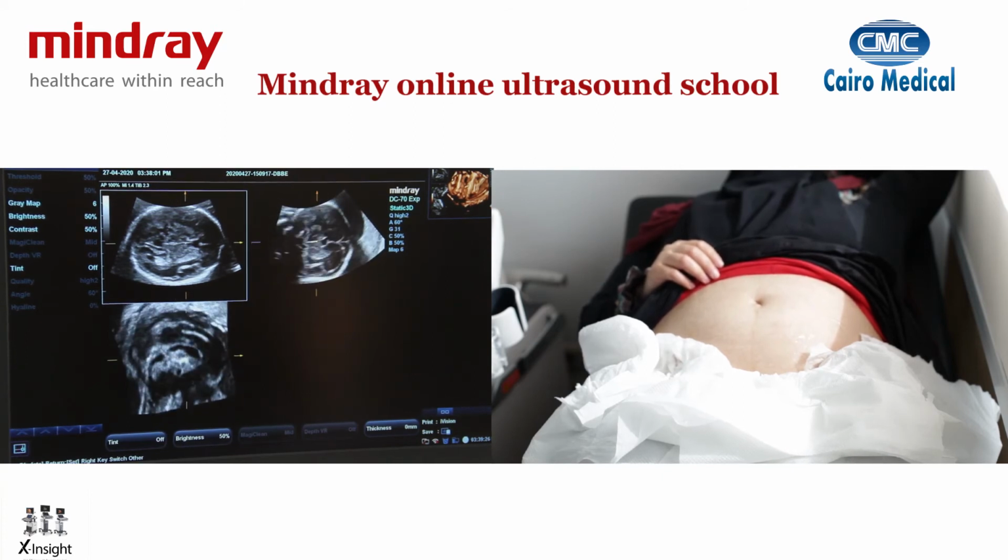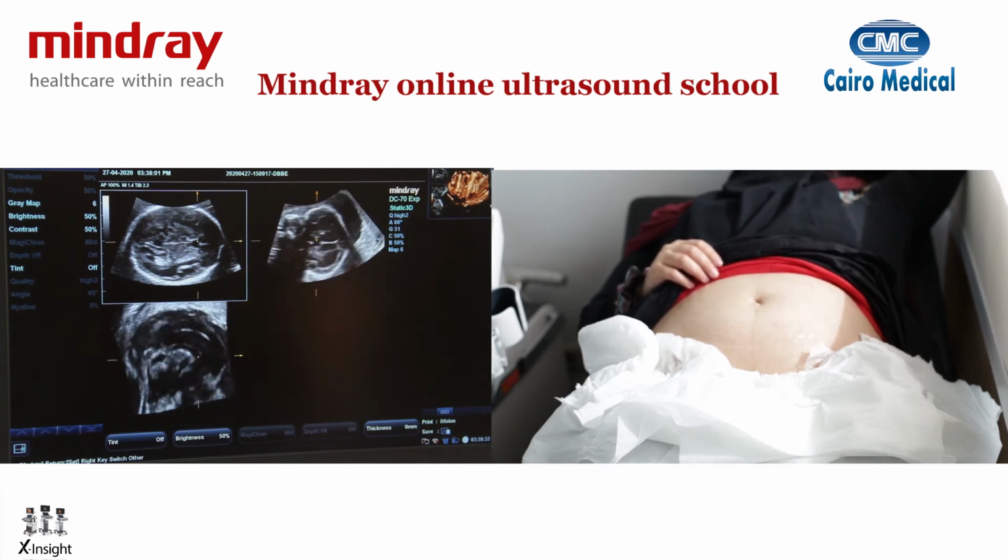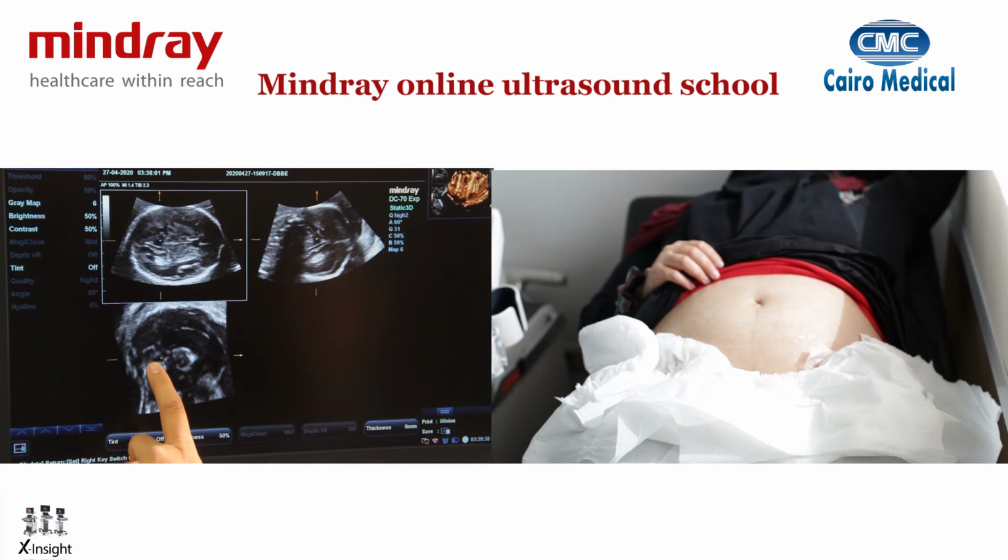So I can actually move across the whole brain and do all the analysis of all the structures of the brain from the anterior aspect, seeing up to the eyes, across the corpus callosum, and the posterior aspect, seeing the peduncles of the cerebellum and the midline structures of the posterior fossa.